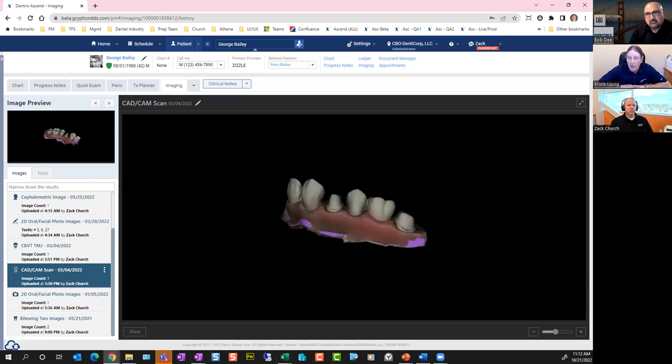They both need a reconstruction or an acquisition PC to reconstruct data into looking like a tooth rather than just a bunch of ones and zeros. But once that is reconstructed, the black magic is over, and now it's an STL or a PLY file, something that we can share back and forth to the lab.